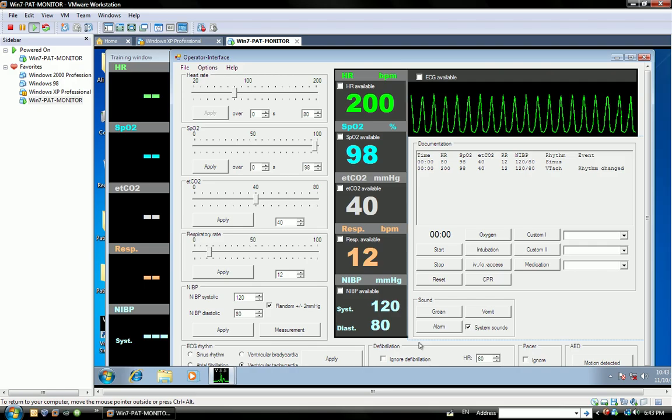The low priority alarms is, but also remember, if the rhythm goes low, the alarm even goes high priority. That means it is most critical for the patient to be saved, and the life must be saved for the patient. Very low or very high heart rates are the most critical form of how a life-threatening heart rhythm is. Okay, that is very important to remember. Then we'll move on to the next bit.